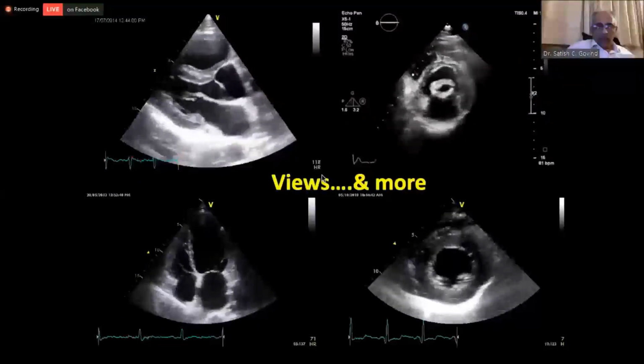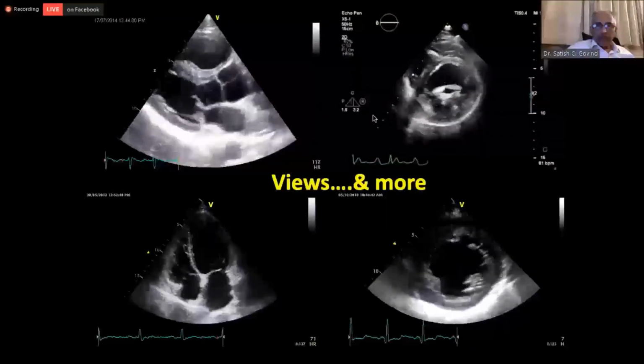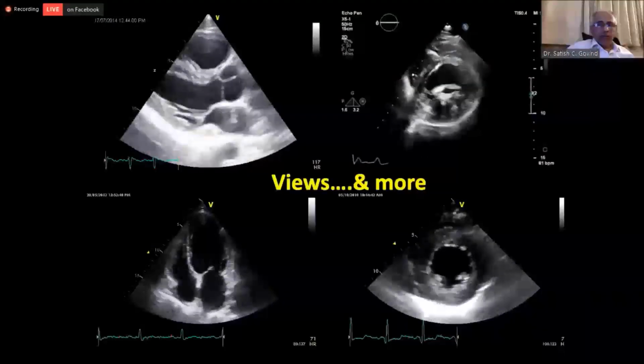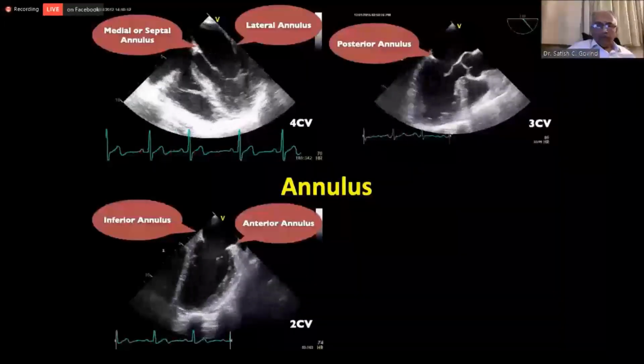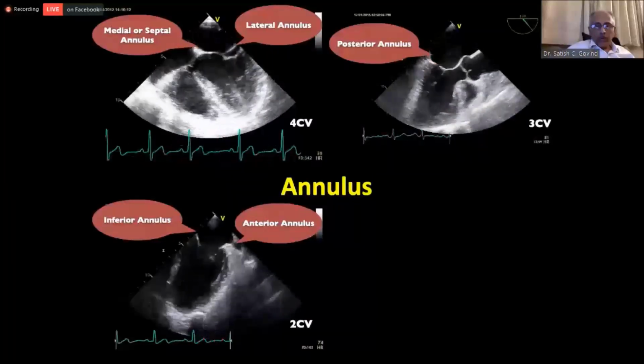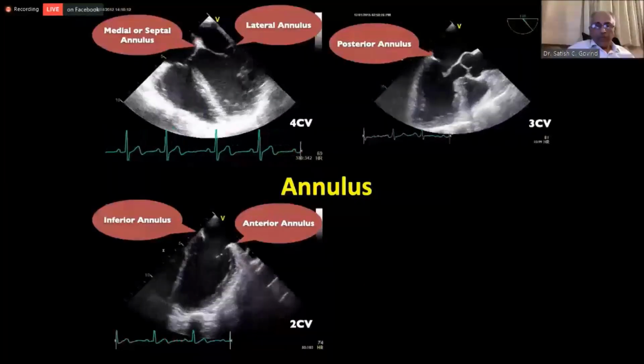So the mitral valve especially is a very, very echo-friendly valve, and that is why you get some excellent images, and these are the standard views in which you see it. Now, I'm switching to TEE. So these images are intuitive, almost like the transthoracic. So let's look at how we can piece together the anatomy here.